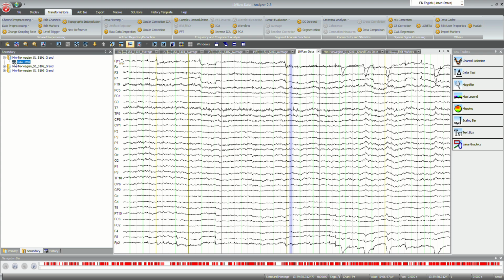More specifically, we'll subtract the gender agreement violation from the grammatical gender agreement condition. That's the first data comparison we're going to make, and for the second data comparison, we'll subtract the ancillary violation, namely number agreement violation, from the grammatical condition.